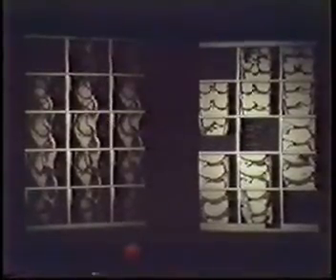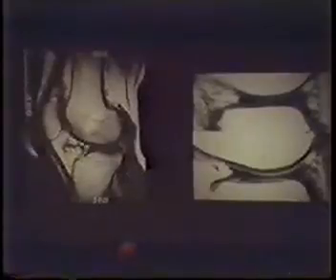And I think there really is a significant improvement when evaluating meniscal disease. I no longer even look at the menisci on these images, but I look at the rest of the knee on these images, whereas for looking at the menisci, I just use the high contrast images. And so the people in the back of the room can see the difference. These are the images that I really like to use to evaluate the menisci, and this type of soft tissue image I like to use to evaluate the rest of the area of the processes around the knee.